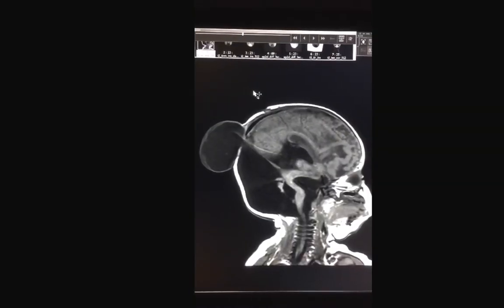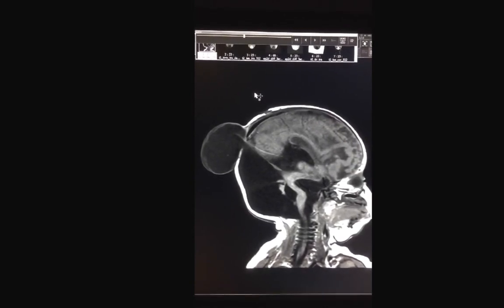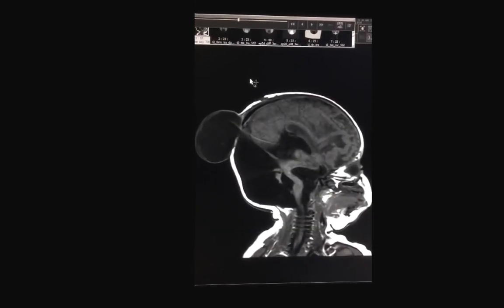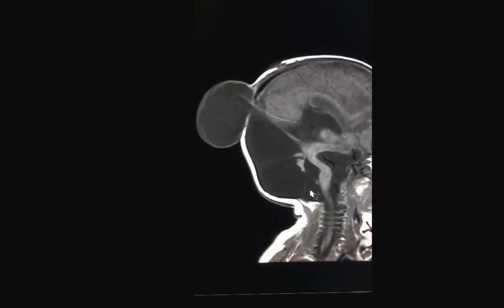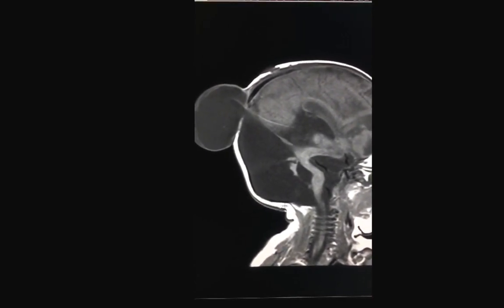This is a pediatric neuroimaging case. It's kind of a show and tell of multiple abnormalities directed for seniors. However, the case is interesting and I'm sure the junior followers would get something out of it as well. One of the major abnormalities is dilatation of the posterior fossa by a cystic structure.